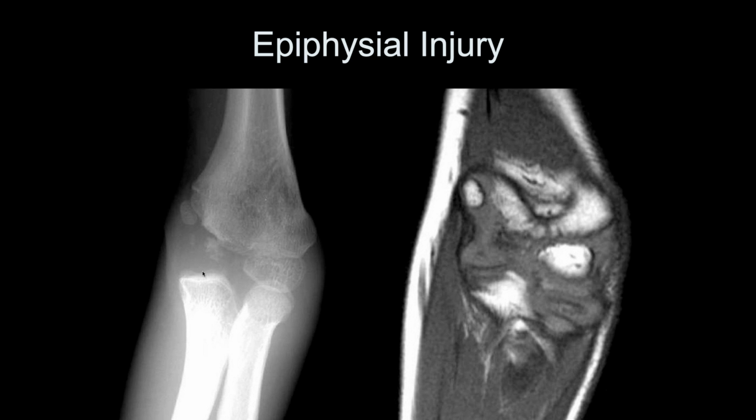Okay, so it looks like there's some fragmentation of the medial epicondyle, and it looks like there's been some impaction and fragmentation.